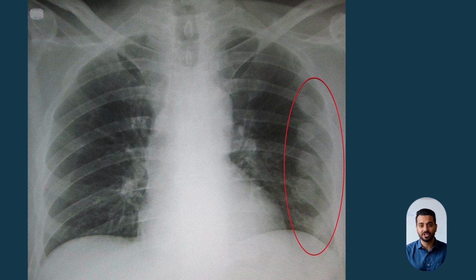These are rib fractures. They are easy to miss if you are not looking for them. Rib fractures are not just about the ribs. Multiple fractures next to each other can create a flail segment. This affects breathing, and if the lower ribs are broken, you must think about injury to the liver or spleen, which sit just below. One finding leads to more questions. That is how radiology works.